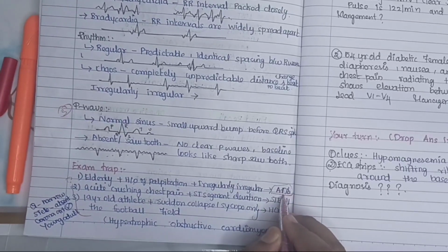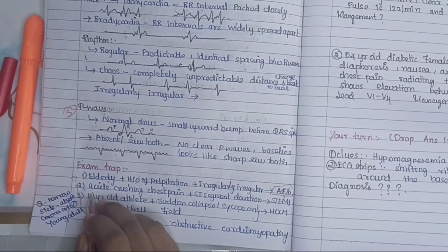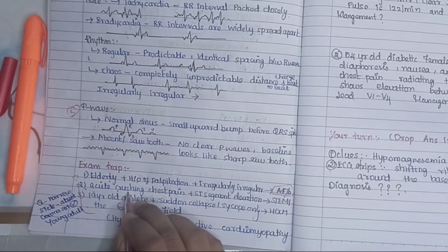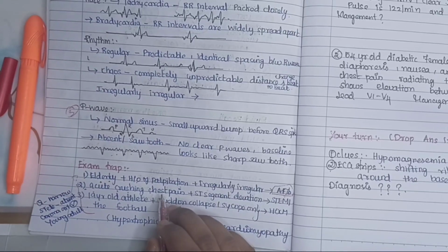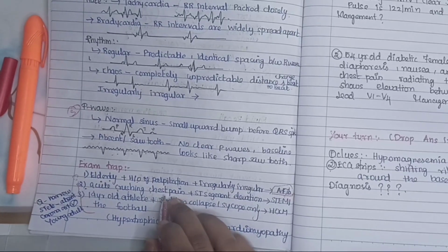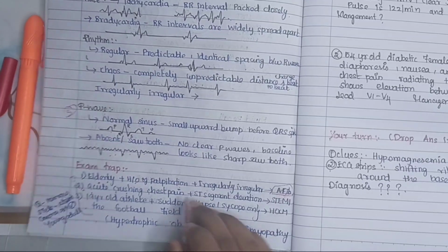Trap number 2 is a critical medical emergency. A diabetic patient with crushing chest pain radiating to the left arm. If the ECG baseline lifts drastically off the ground, it is the classic tombstone appearance of a STEMI. Your immediate next step will be emergency reperfusion.